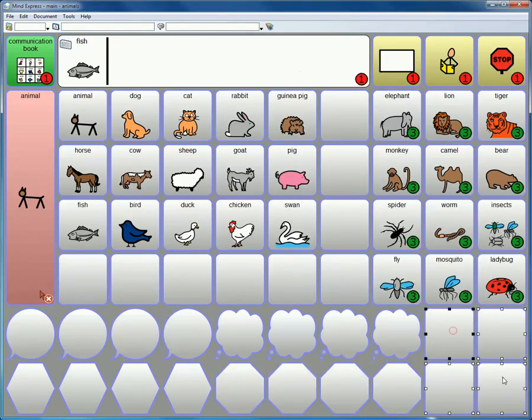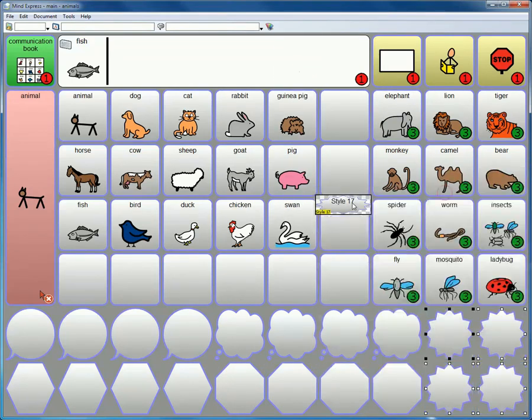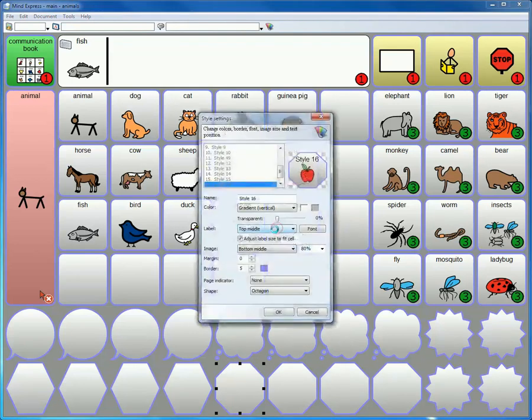So you have a speech bubble, a thought bubble, a star, then a hexagon and an octagon. The way you specify them is by going in the style settings, to shape, and on top of the rectangle, the rounded rectangle, the circle and the folder, you now have these 5 additional shapes. This gives you more flexibility when you're designing your communication board.